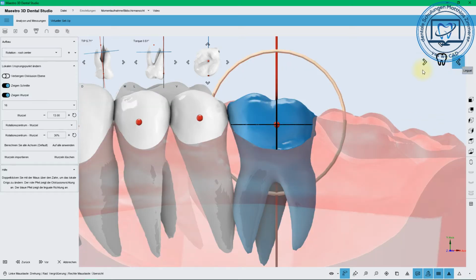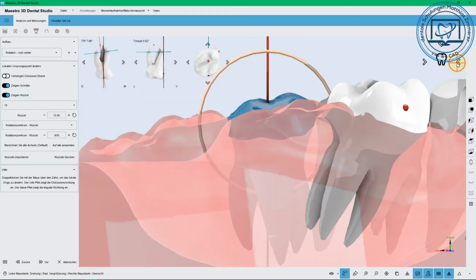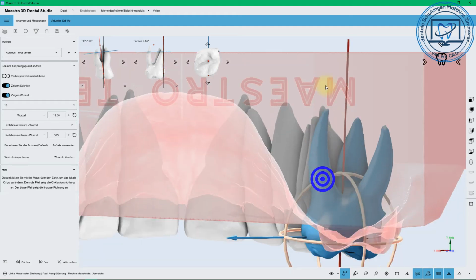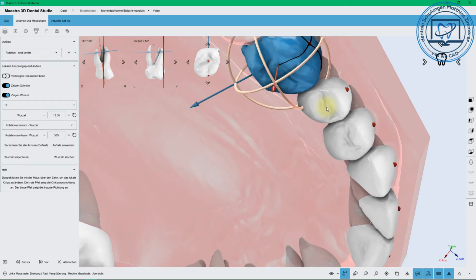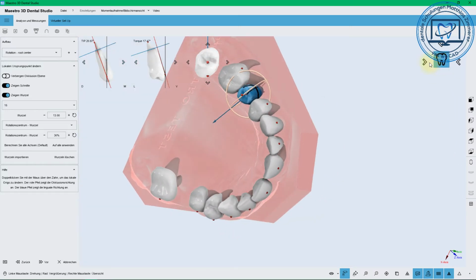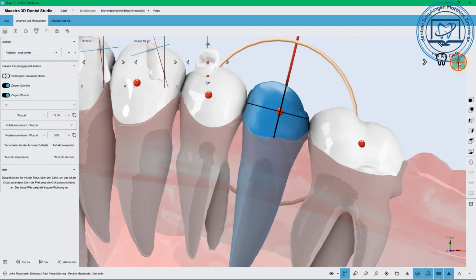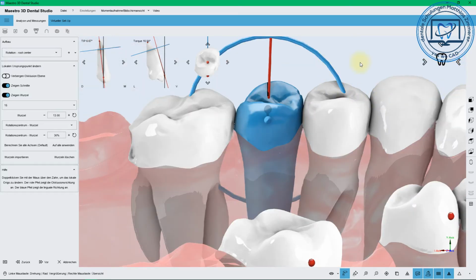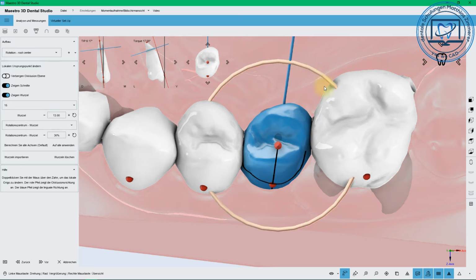Also on the right, if you press on the symbol, you can show only the upper teeth, or the lower, everything is possible. Just double click on the next tooth. You will also see on the left up how the root is changing, so you can normally click very fast and comfortably through this process.